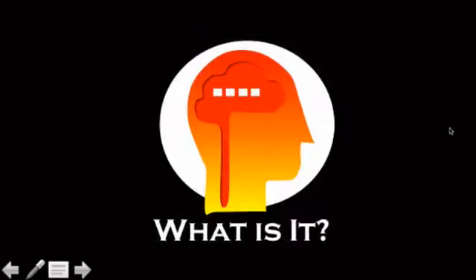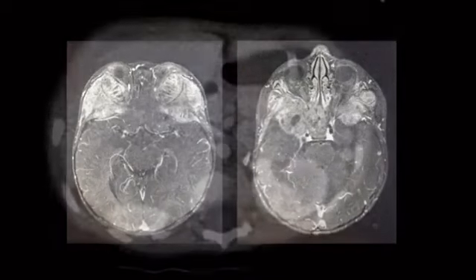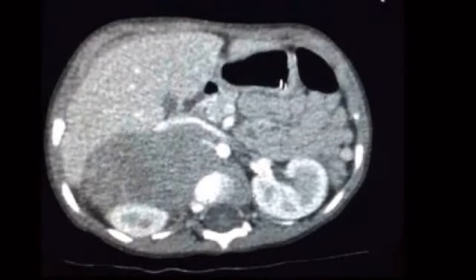All right, moving on, and this is a classic look. Okay, so we've got MR imaging here. We've got these big bilateral masses in the periorbital region, and this is classic neuroblastoma mets. The raccoon eyes.